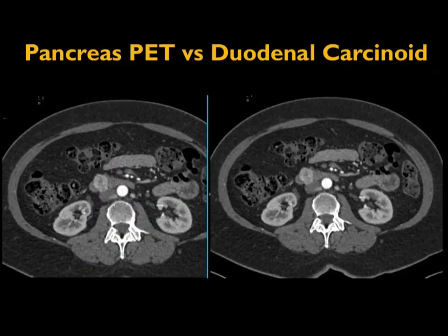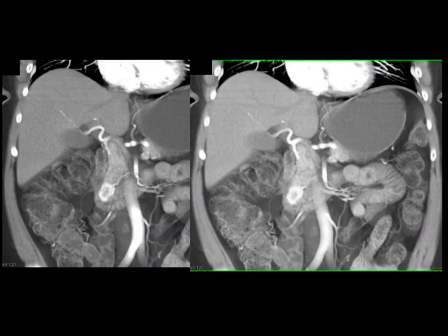Another example here. This case was sent in for pancreatic cancer, and because of the brightness, they thought it was a neuroendocrine tumor. That's a good thought. Sometimes it's hard to tell masses off the pancreas or off the duodenum. This, in fact, when you look carefully, you can localize it better, see the feeding vessels. But again, if I told you this was coming off the lower portion of the pancreas, I could convince you at surgery this was off the small bowel.